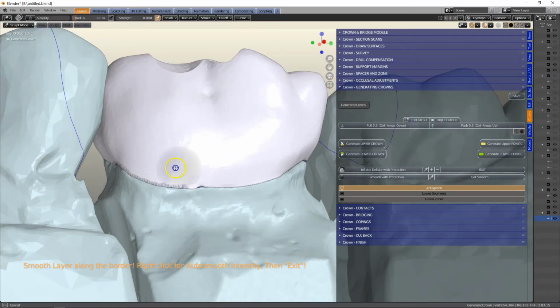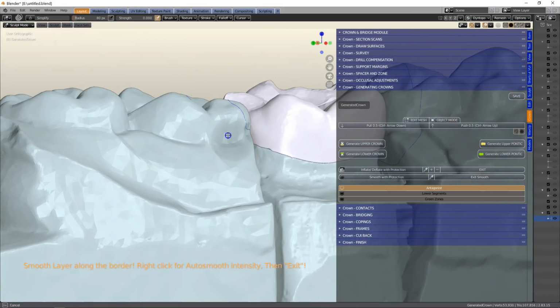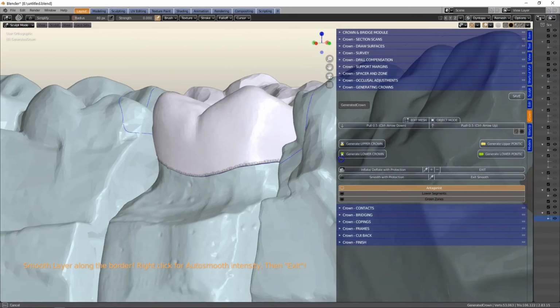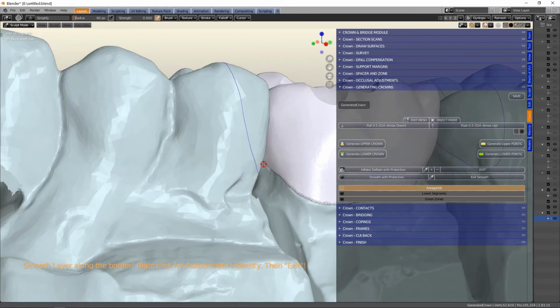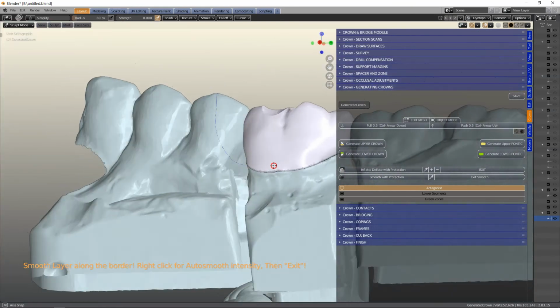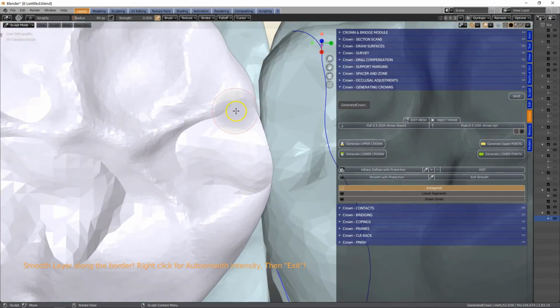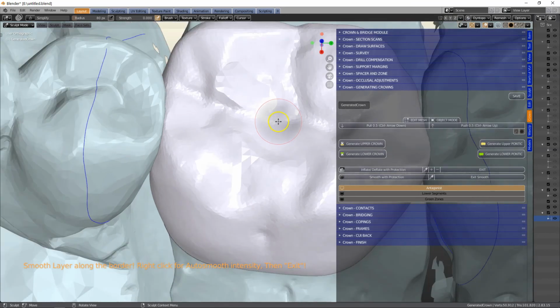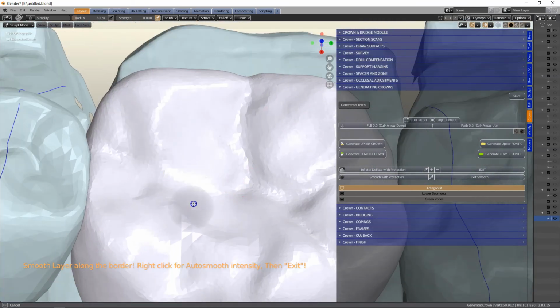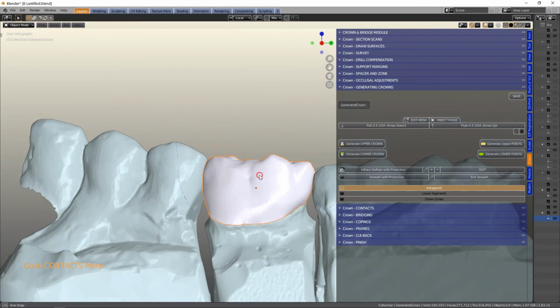This means that the inside surface has been safeguarded. So it would smooth through the model. No need to hide anything. Right, we can give this a gentle smooth as well. So now that that is done, exit. We are finished with this one.